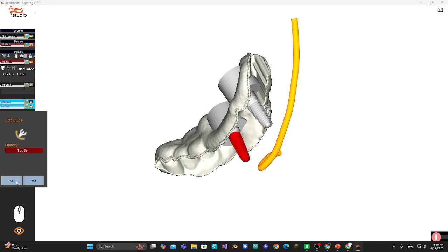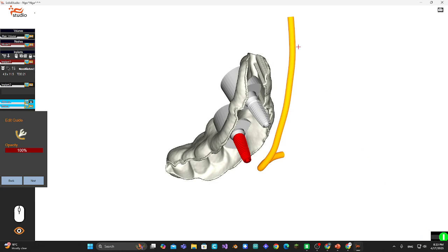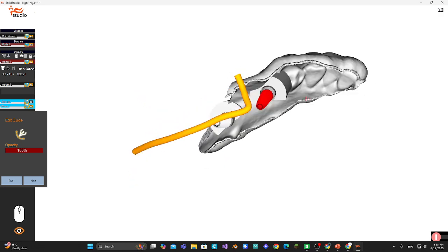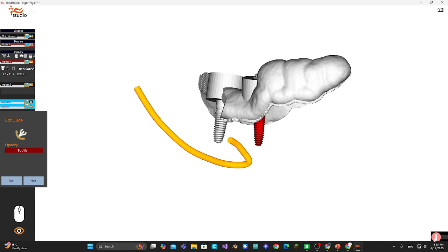You just click on this icon and again the action button appears. If you use the mouse, it will rotate. Now if you turn it on and you do clicks, and finally a double click, as you can see, it's cut away. You can also do this cut, double click, and it will be cut. To end your drawing, you just double click on the icon. Let's say you need to cut this area also. You do it like this, double click.